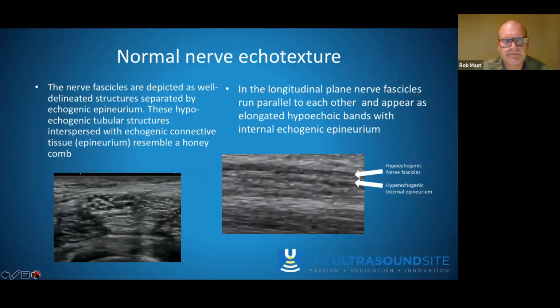Yeah, and we're going back here again. This is probably a slide that I should have shown earlier. Nevertheless, this again goes through the honeycomb structure. So in cross section, you can see very clearly the black and white honeycomb structure.